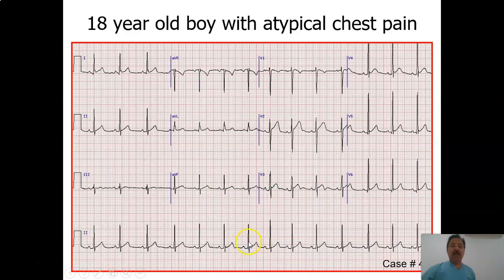This looks like a slightly irregular ECG. If you see, the RR distance here is different, and in this place the RR is different. So we'll follow the 6-second method of rate determination. Six seconds means 30 big boxes up to here. Count how many QRS complexes: 1, 2, 3, 4, 5, 6, 7 or 8. 8 times 10 is 80, so the heart rate is 70 or 80 approximately, because the heart rate you calculate will be approximate. The exact heart rate will be calculated by the ECG machine.